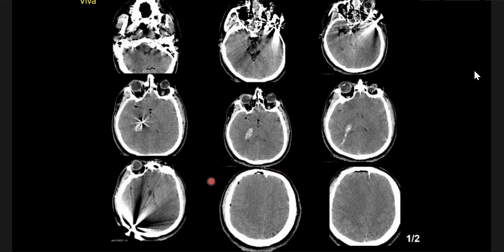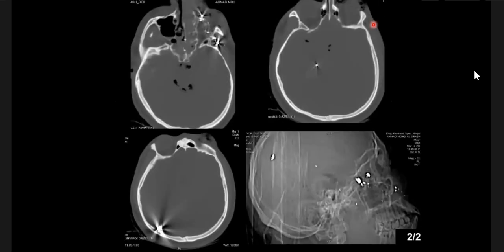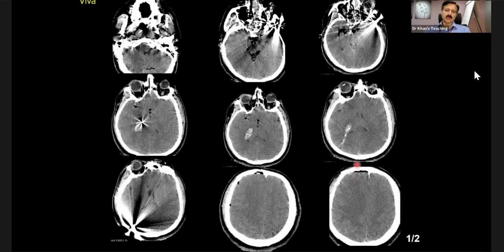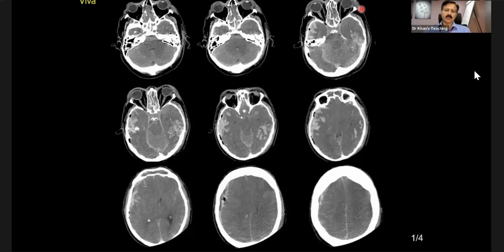I'm just trying to categorize the hemorrhage. What is this? What is this? You were worried about embolization clip. This is metallic density. That's the hint. Oh, he's got a traumatic injury, like a bullet injury or some sharp injury. I just wanted to show you this patient because otherwise you will get confused, as you did get confused. It's very easy. Shotgun and multiple pellets, and more or less brain dead.